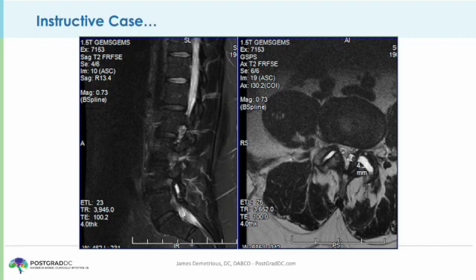The patient was adamantly against having surgery, so he sought care at my office on the referral of another patient. When I reviewed the MRI, we can see on this sagittal view, this parasagittal view, some inflammation and edema, a Modic 1 change of the inferior end plate of L4.